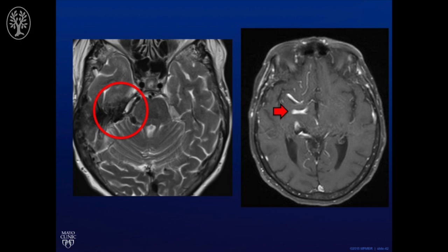Her CT scan was normal, however, the MRI demonstrated a possible vascular lesion along the free edge of the tentorium on the right side that had a prominent venous drainage in relation with the brainstem, including the vein of Rosenthal. Based on this imaging, we suspect arteriovenous fistula or arteriovenous malformation, and an angiogram was the next step for further evaluation.